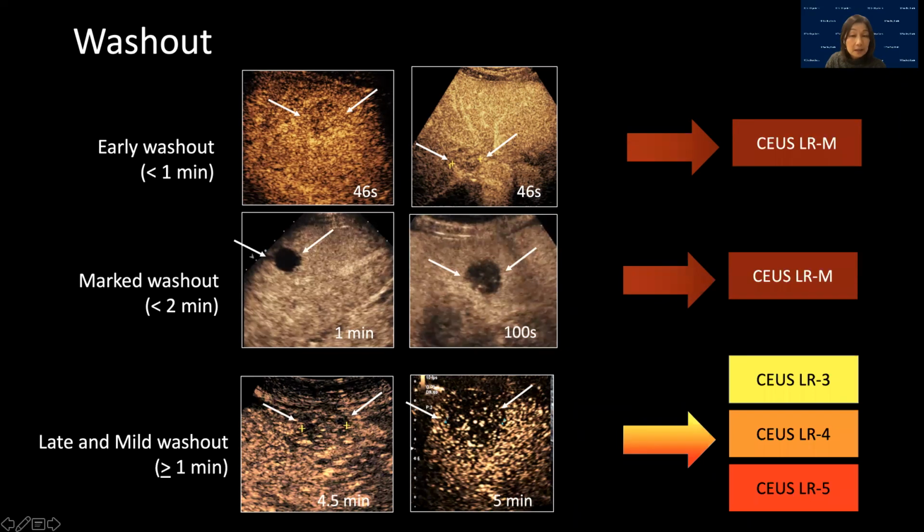Now, I get asked sometimes, when can this washout become marked, right? Like this washout happens at 2 minutes, and then by 5 minutes, if you keep watching, it can become black like this. Is that marked washout? No, marked washout happens before 2 minutes.